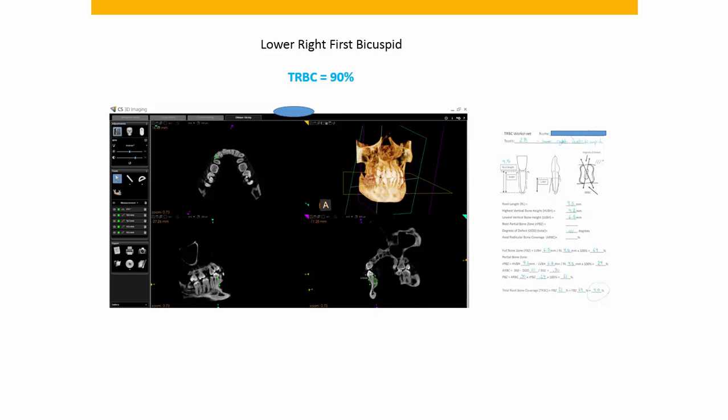Now, I was really hoping that one of these would show a 50% total root bone coverage, and then it was kind of more of a no-brainer, and we would extract that one tooth in that lower right quadrant. But that didn't happen. It's interesting, sometimes just looking clinically, you can get fooled. With cone beam CT, you can measure individual teeth, and that's the beauty of 3D radiographs.